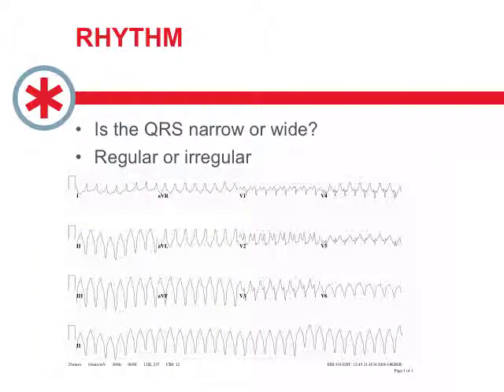All right, so not a great looking cardiogram. So this is ventricular tachycardia. So you have a look at it, the QRS is wide, which makes me think this is potentially ventricular in origin. It's really fast, isn't it? So it's got to be around 250 beats a minute. And it's quite regular. So regular, wide, fast equals ventricular tachycardia.